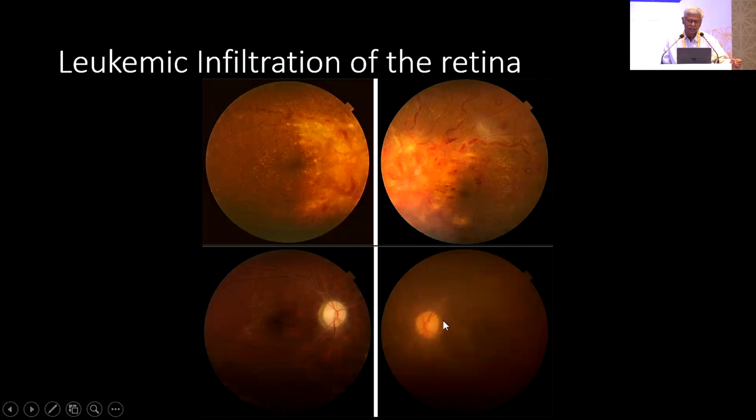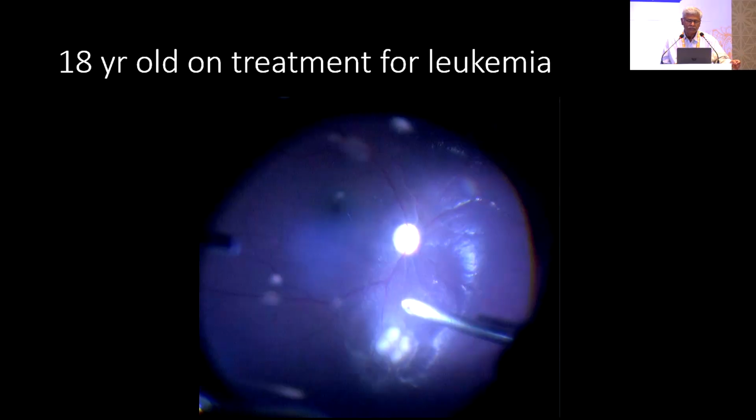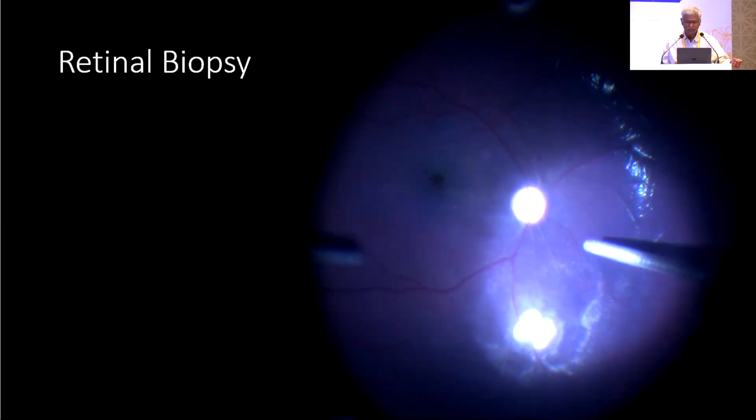You can see the infiltrates have resolved, and of course there is optic atrophy in one eye, but in both the eyes, the patient is able to see better. On the other hand, this was an 18-year-old on treatment for leukemia presented with these infiltrates. So the oncologist wanted to know if this was a leukemic infiltrate, because if it is a recurrence of the leukemia, then he wanted to upstage the disease and advise total body radiation and bone marrow transplant in this particular patient. So we needed to know if it was indeed a leukemic infiltrate.